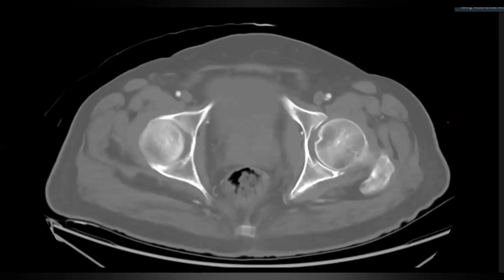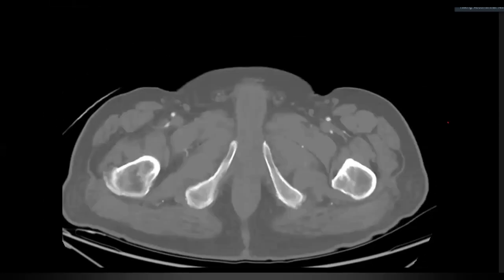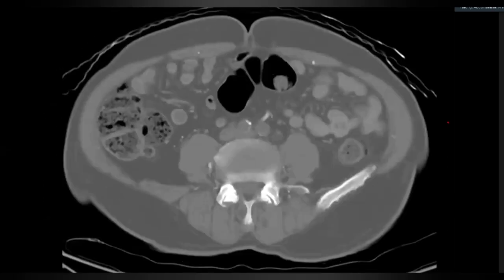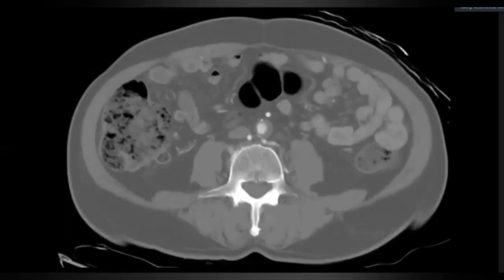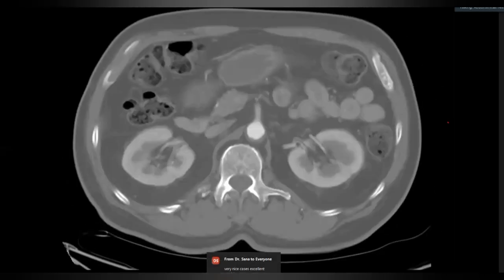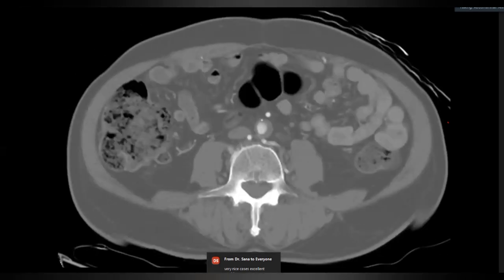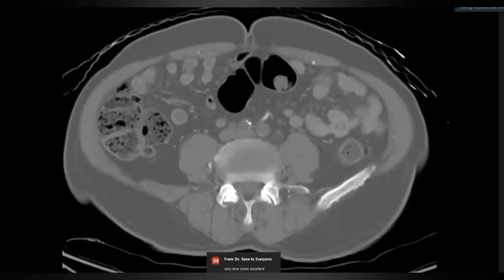And the common femoral artery is reconstituted by, you can see these inferior epigastrics and circumflex iliacs. These then reconstitute the common femoral arteries. So what I wanted to show you is this is again aortoiliac occlusive disease. So again, anatomy is very important. Knowing your arterial anatomy is very, very important. So this is an atherosclerotic occluded distal aorta and common iliac arteries. This is not an aneurysm.